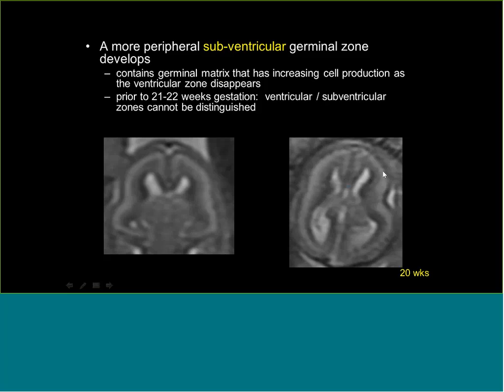Can you just go back to the ventricular zone? I can sort of see 2 layers there. You can sort of see 2 layers. Well, that, my friend, is you have a good eye or a good imagination? I have neither. Isn't there a darker internal and a grayer external?